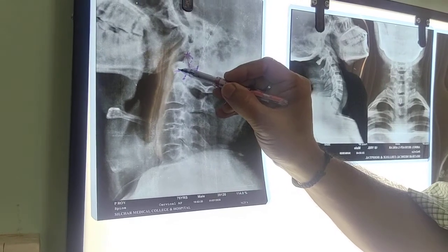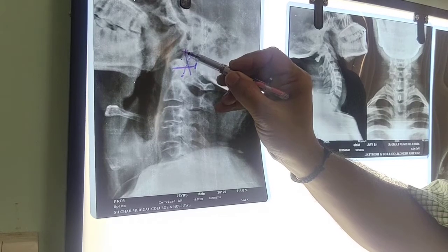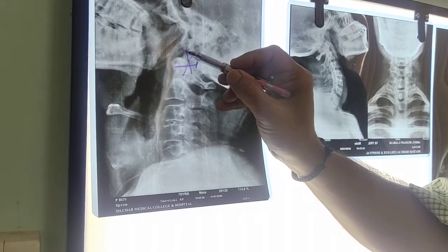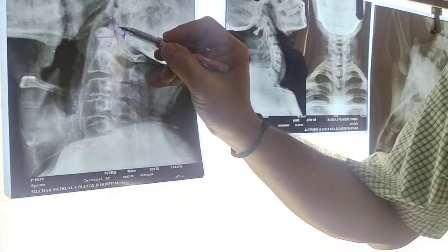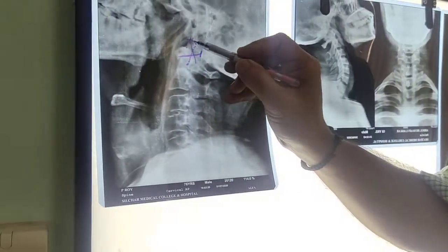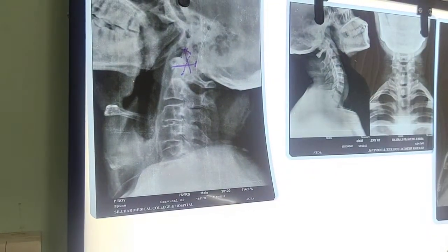Harris rule of 12 is that this line extends from the tip of the odontoid process towards your basion. Another line goes from the posterior side. Then the junction line is joined like this, and these lines are almost equal, and they are 12.